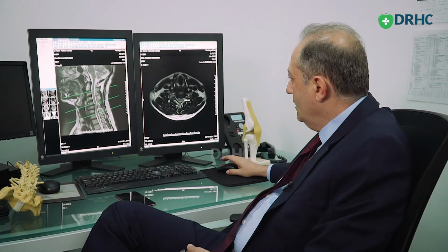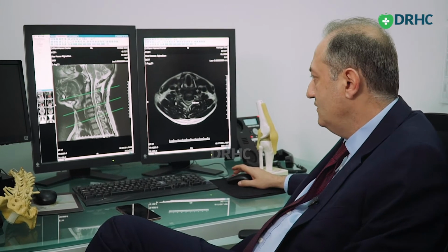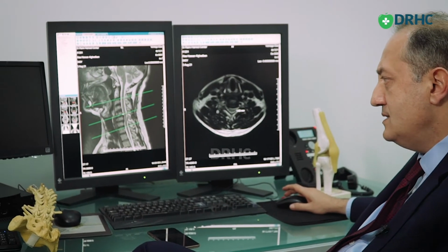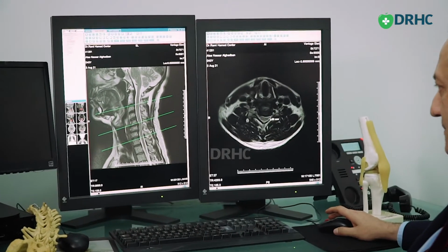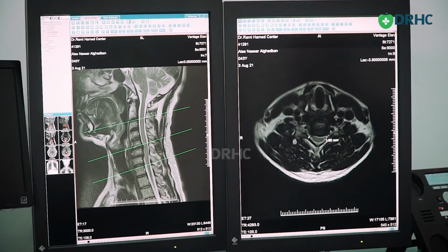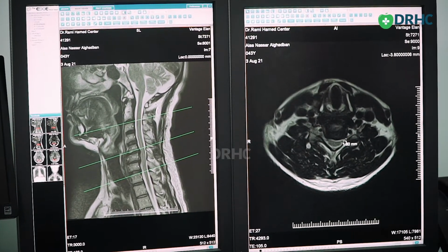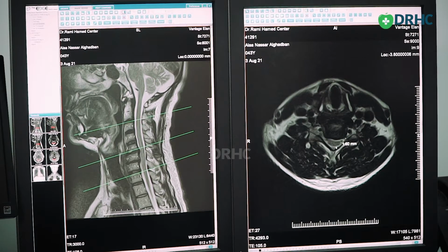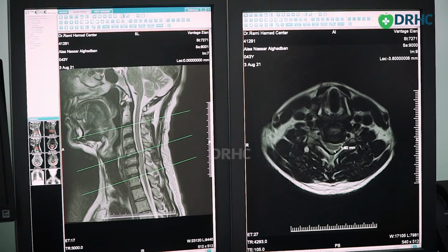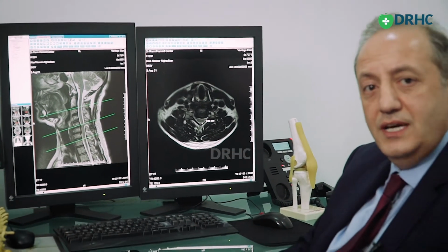Now, this patient came complaining of neck pain radiating toward his left arm over a period of 2 years. We did this MRI scan, we can see the bulge in that disc and that disc, and we assess the width of the canal together with the clinical findings of radicular pain and weakness, and we decided that this patient requires surgical intervention, and the preferred operation for me in this respect is usually a disc replacement.